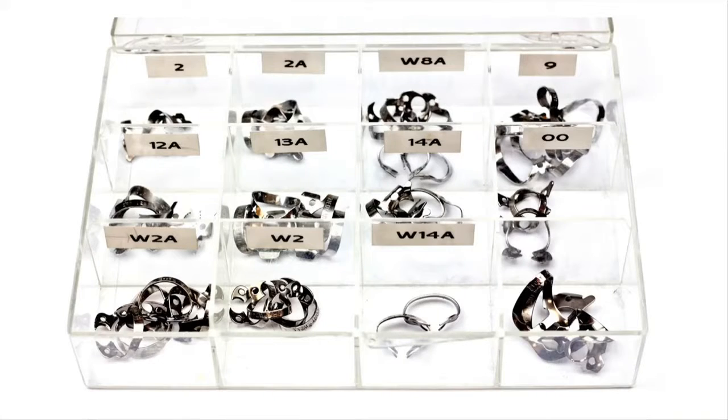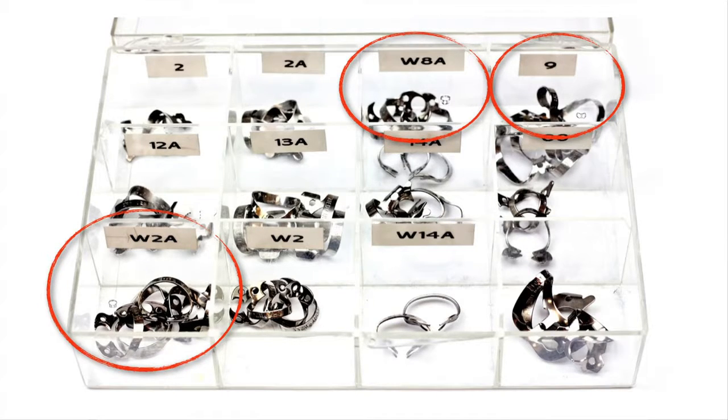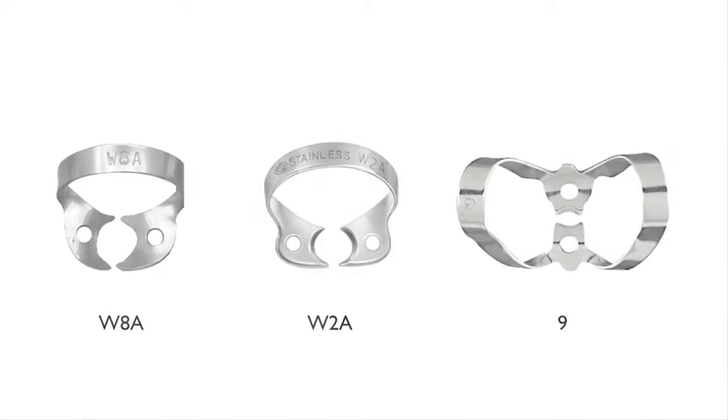Types of retainers. I've heard a lot of clinicians talk, especially the last course I went to, saying you have to use these winged retainers, you have to use this specific retainer. Well, I got a lot of retainers in my office. I practice with a partner, so he likes different ones than I like. I like the wingless ones. There's not many cases I can't get through with these 3 retainers. We've got the number W8A for molars, W2A for premolars, and the number 9 for anterior teeth. I can treat 90% of my cases with one of these 3 clamps.